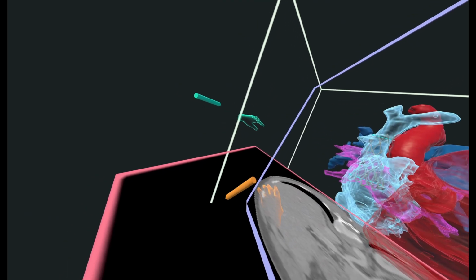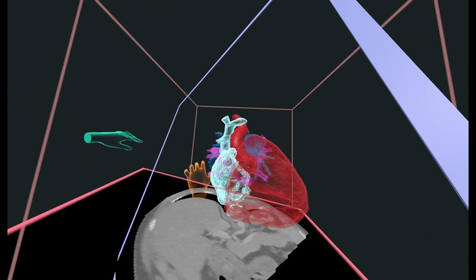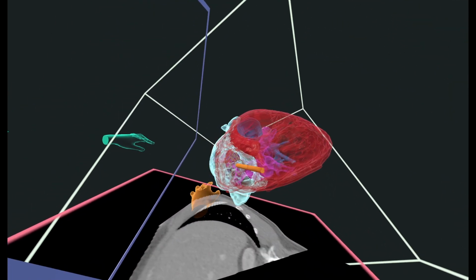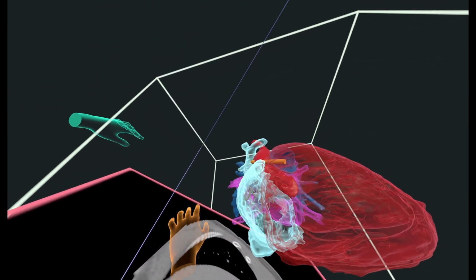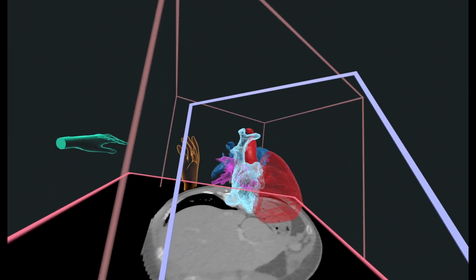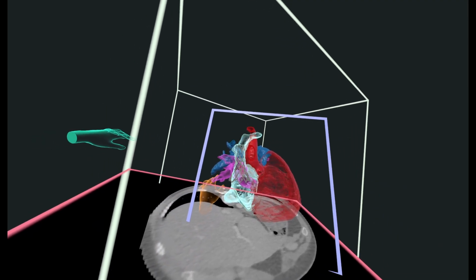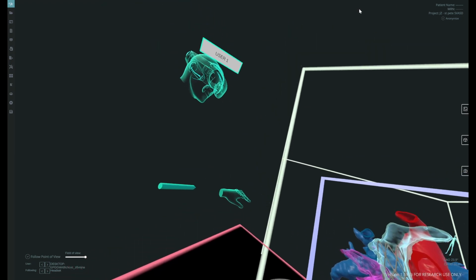And go to the planning tools and flare that even further. And we can erase that other measurement at the moment. You can see how nice that looks. So that's a nice stent planning tool.